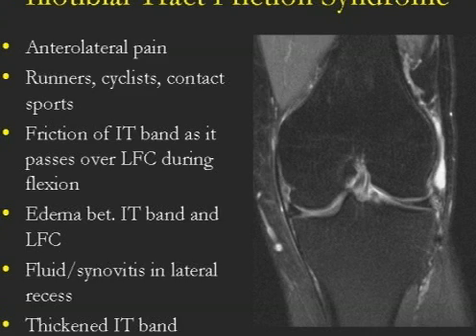There's not a lot of fluid anywhere else. It's all over here in the lateral recess. The iliotibial tract is thickened. Those are the findings that you're going to see in iliotibial tract friction syndrome. And again, a thickening of the iliotibial band.